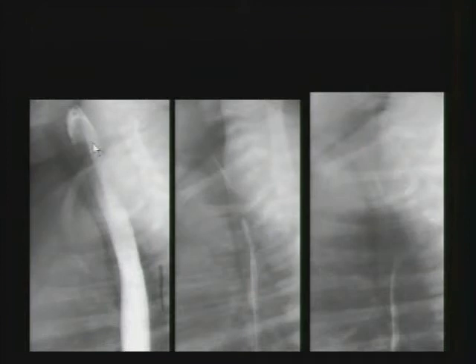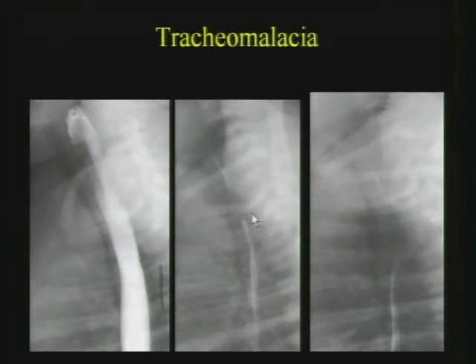Another thing that we see very frequently during esophagograms and other fluoroscopy is a narrowing of the trachea on the lateral view. Again, I'm not sure how well this projects, but you can see that on this middle image, the trachea looks very narrow on the lateral view, and that's generally during expiration. And in the same examination, a few seconds later during inspiration, the caliber of the trachea will be normal. That's just tracheomalacia. It rarely leads to any problem clinically. Most of the time it's just a normal variant, and they outgrow it as the trachea becomes more firm.